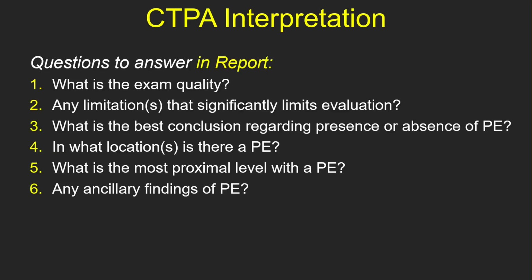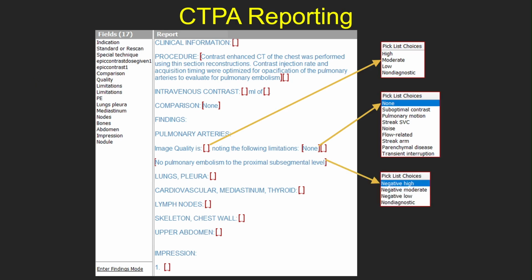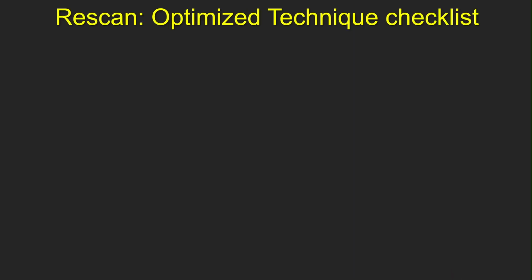Now that we've answered all of our questions, we can put them in the report. This is a structured report with pick list choices for quality, limitations, findings, and impression. If non-diagnostic is selected in the impression, a rescan can be performed. For most rescans, we can use this optimized technique checklist.